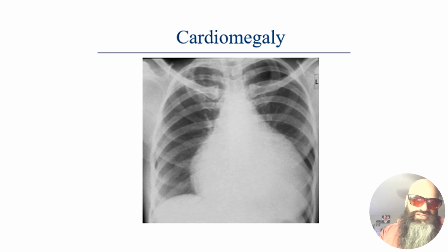Cardiomegaly. Now I discussed the many etiologies of cardiomegaly. It could be due to what we call dilated cardiomyopathy, where the cardiac muscle is becoming very weak and is unable to basically pump the blood into systemic circulation, so it becomes more flaccid and starts to spread out, encompassing the entire area of the mediastinum.